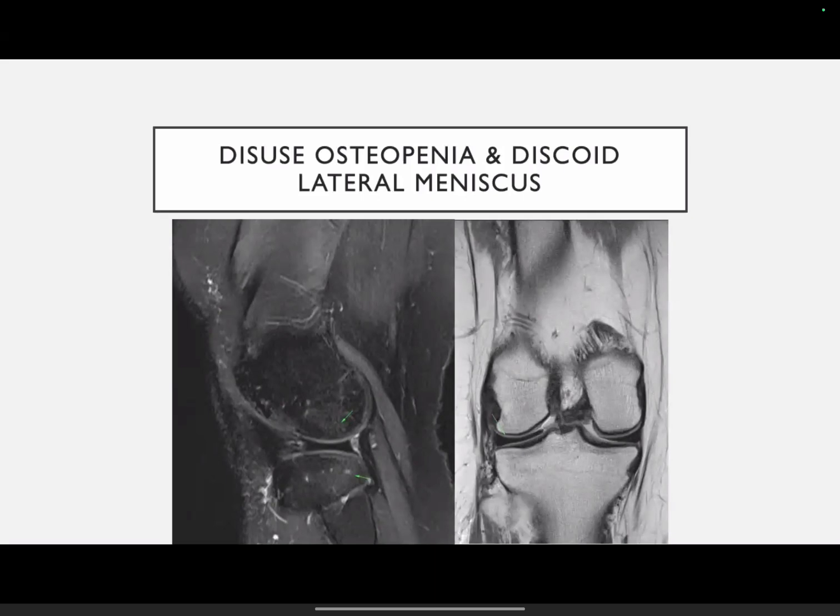So we have covered three patterns. One is around the growth plates, the second was along the apophysis, and the third was along the subchondral bone. So these are very commonly seen areas which we will encounter in our daily practice every now and then.